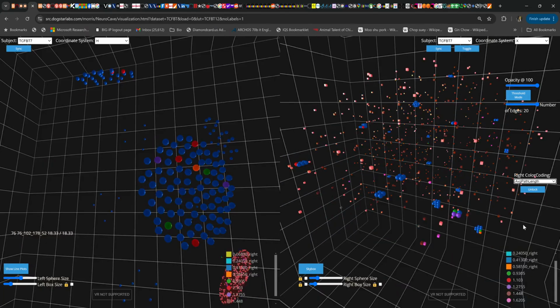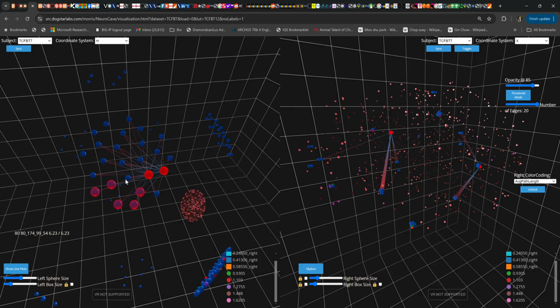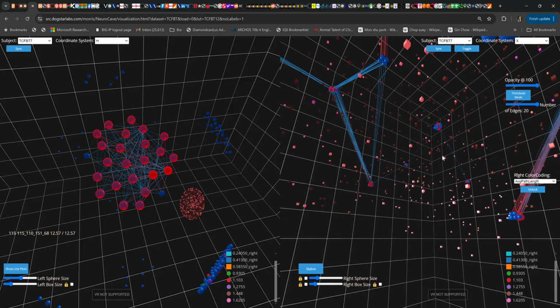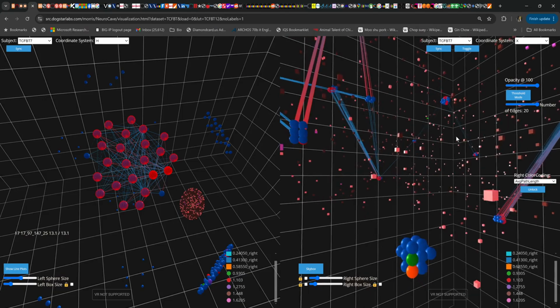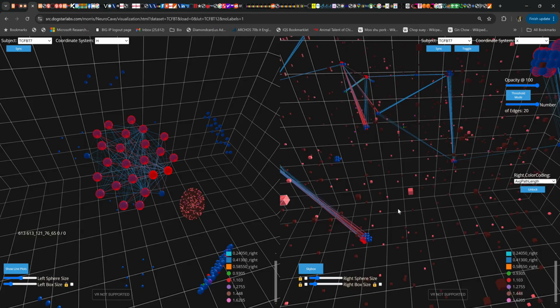The average path length, try to light up this whole cluster that contains the two nodes with one of the shortest average path lengths. Well, that cluster is prolific, but this tumor here does not have any cells of that cluster in it. So that might be an interesting finding.